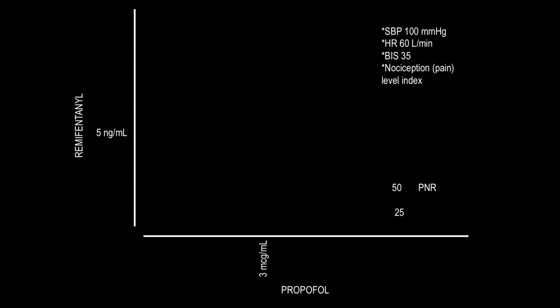When administering remifentanil and propofol, they interact in a synergistic manner, and the TCI system does not integrate the information of said interaction; it simply responds to the infusion for the concentration that we choose. As we see in the graph, the TCI systems and some simulators will only allow us to move on the 2 axes. This is the main shortcoming of these systems.